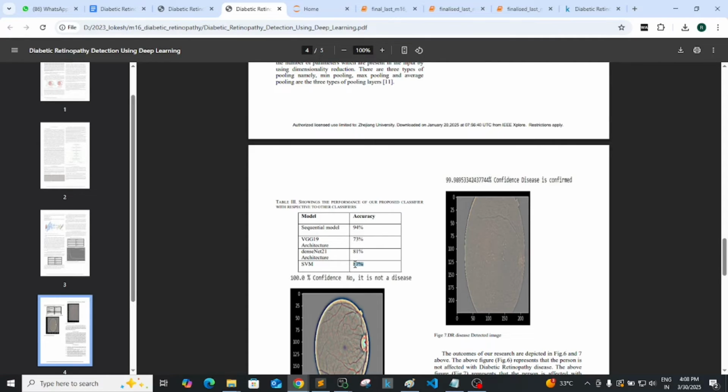But in our case we are getting more than 96, nearly 97. I will even show you two other models in detail. I will show you what models I am using and how much accuracy we are getting now. So this is a way to decide what to do based on the existing technical system. You need to define the technical proposed system.